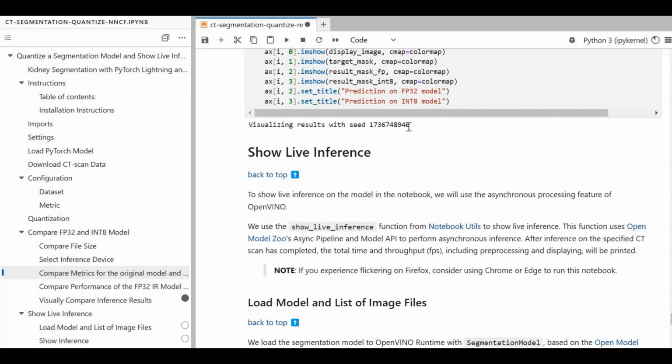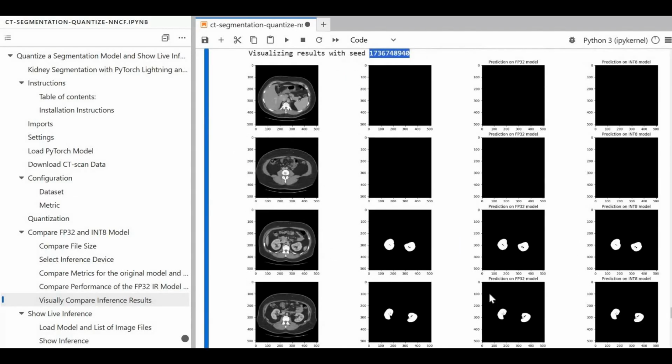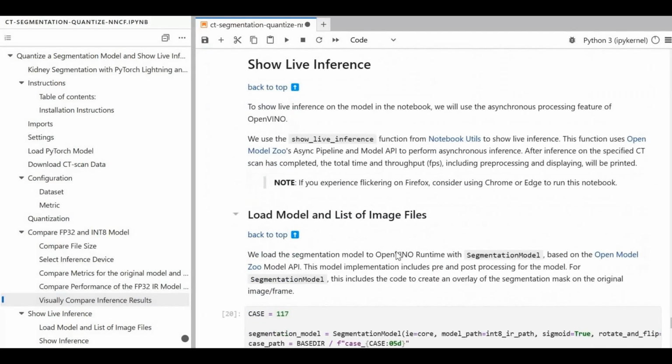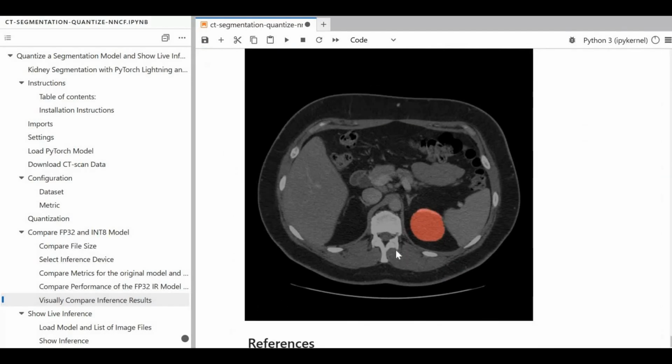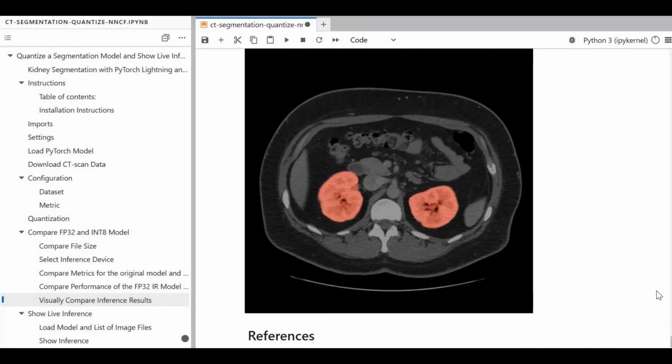And you can see that we are getting the results up to time, and that's it. Now we can go ahead and see the live inferencing here. I'm going to run that step. That's it. We got it. It's working fine and it's very easy to understand.